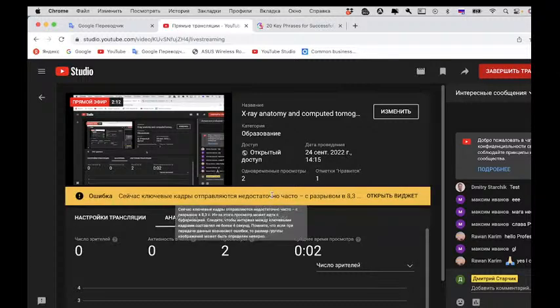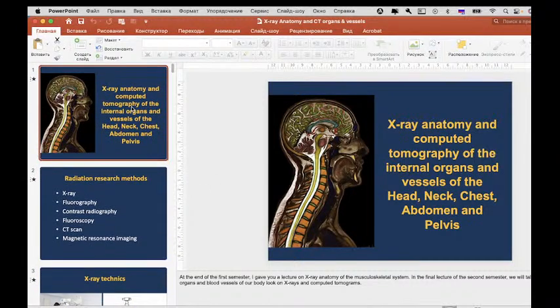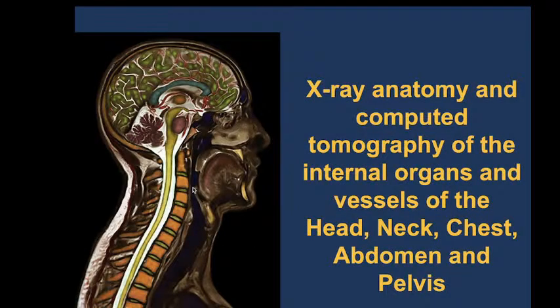In this lecture we will talk about blood vessels, and see mostly the head, neck, chest, abdomen and pelvis parts of the body, refreshing our knowledge about organs and vessels as well. So let me switch off and open the demonstration.